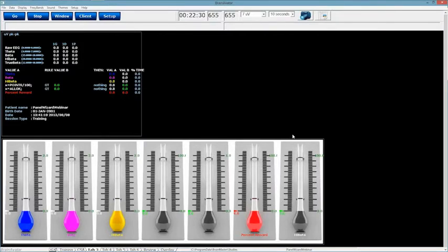Okay. Now you're going to notice a difference between my thermometer contours display and my text stat display. You're going to notice that right after percent reward, nothing has been added. But in my thermometer contours, you're going to notice that I have a thermometer named high beta at the end.